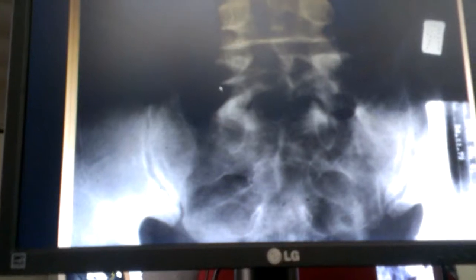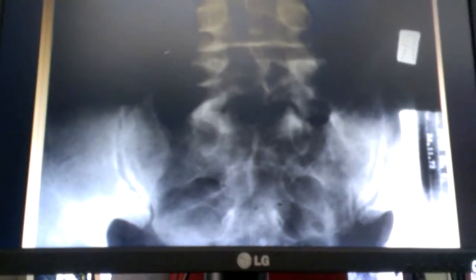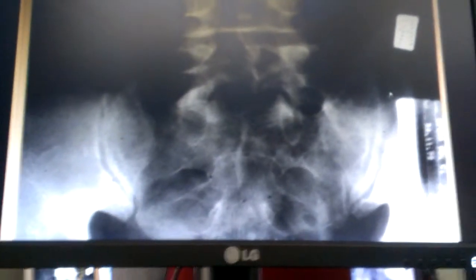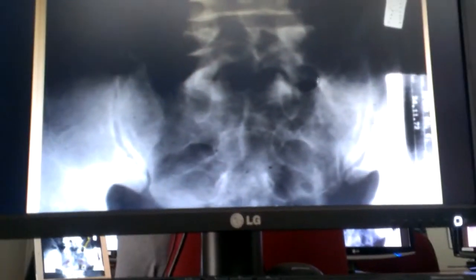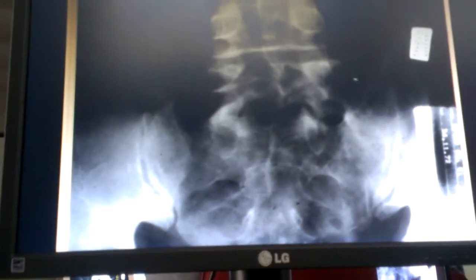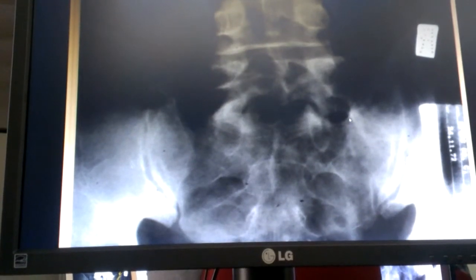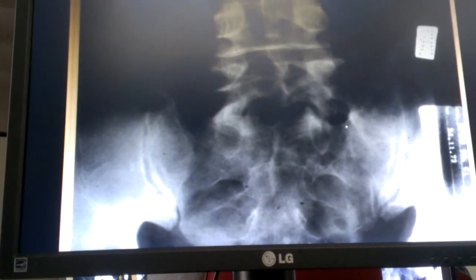Okay, so I do call them accessory articulations. Now, this is a nice one. Here you've got somewhat of a normal, not really though, it's spatulated, it's larger. Compared to the ones above, you'll see that this has more height to it. Here we do not have an articulation, but this is quite characteristic. Whether you do or don't have an articulation, the relationship between that spatulated process and that ala oftentimes results in the formation of a bursa like that.